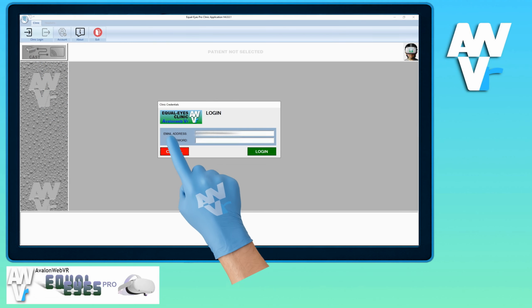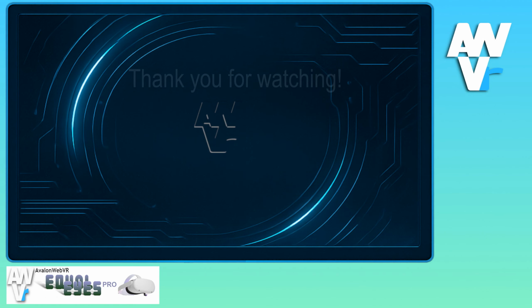Well, that pretty much sums up the Getting Started guide to the use of the clinic application.